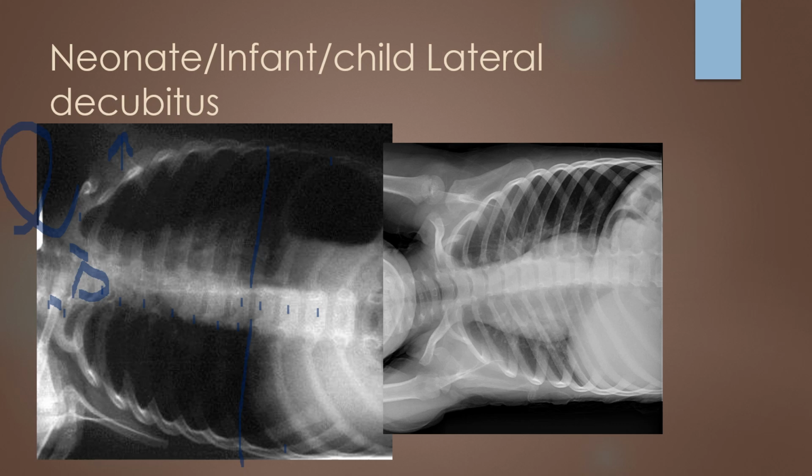But what I do want to bring your attention to, we talked about how sometimes hemidiaphragms work slightly separately. Here's one diaphragm. Here's the other diaphragm. This diaphragm goes much lower than this one. So I just wanted to bring that to your attention. And so then you can go ahead and, it looks like just off the bat, those look like really flattened ribs. That's got to make me think that there's some mid-coronal tilting, but I'm going to let you guys evaluate that image. So I'll catch you on the next slide.